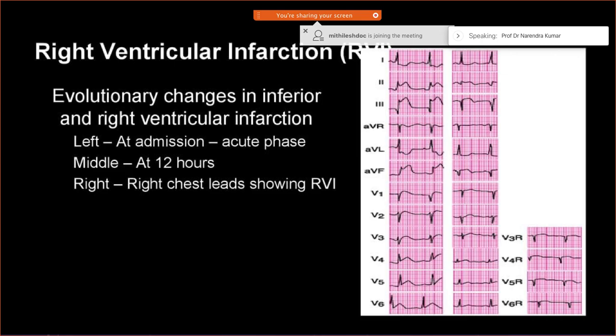That also can be anticipated. Good. Okay. The probably damaged area, wonderful. And what else? What else? Please mute your microphone, Savitri.